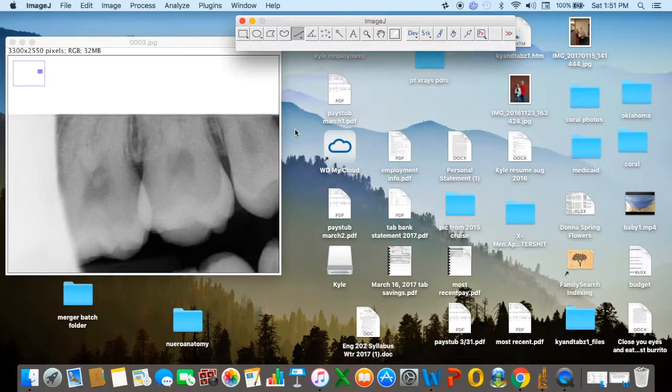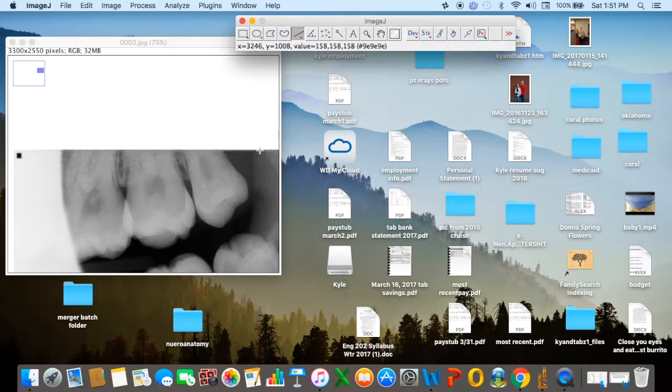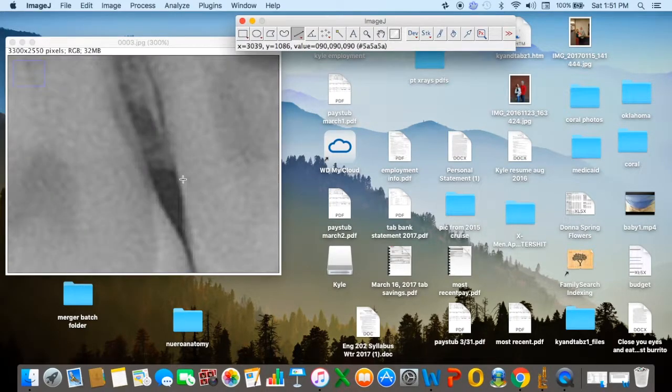Okay, go ahead and clear that data out. This is an important point to note. Some patients will have wisdom teeth, some won't. Just remember that is 16, and we're not measuring that, so we'll be stopping here. Beware of that on the other side as well when we're starting out. We don't want to start out measuring 1 instead of 2.